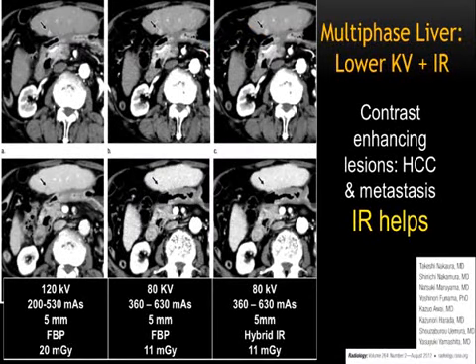Another example, this is a Japanese study published in Radiology. And again, these guys actually did 120 kV. So a good starting point, looking for that tiny focus of enhancement there. And then they dropped the kV to 80 kV. And they, of course, used dose modulation.